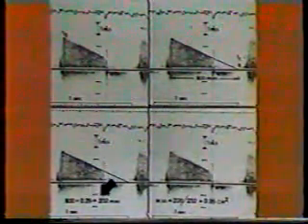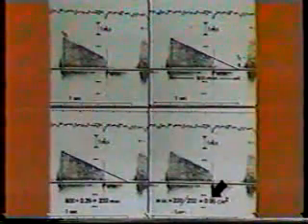The deceleration time of 800 milliseconds is multiplied by the constant 0.29 to yield the pressure half-time, 232 milliseconds. We now divide the constant 220 by our pressure half-time, 232, to determine the mitral valve area, 0.95 square centimeters.